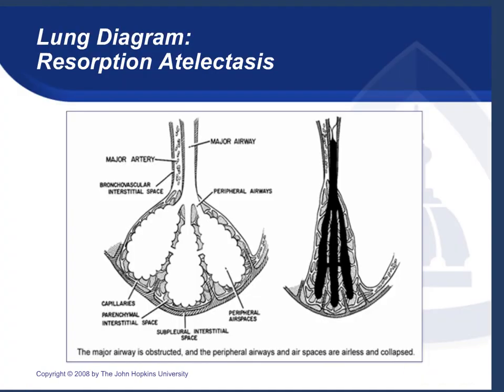When we talk about lung collapse, we use the word atelectasis, and the things that can cause that, you can either have something inside the airway, which leads to collapse of that main airway leading to the alveolar space, or you can have extrinsic compression. And the end point of that is that no air goes into the alveolar spaces. The air that is in there is resorbed, and the lung collapses. Any segment in the lung can collapse, and there are a few patterns that are probably important to recognize on the x-ray, and I'll show you those.